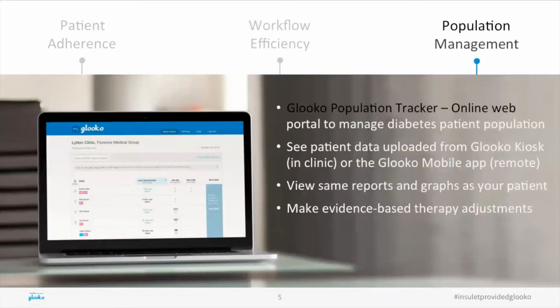Lastly, the Glooko Population Tracker is your hub for managing your diabetes patient population online. You can see a list of all your patients whose data has been uploaded in clinic with the Glooko kiosk or at home with the Glooko mobile app. For each patient, you can see quick statistics about their latest diabetes data to help you identify which patients are most at risk and provide timely care. Again, you can select to print a PDF report of their data or click on the patient to view their interactive reports.